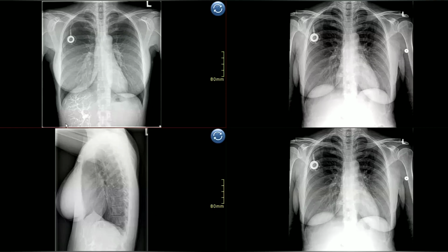So this patient had chemoembolization because she had multiple hepatic mets from a colorectal cancer. And this is a porta cath. So this is TACE basically, the lipiodol embolization, pre-embolization prior to surgery.